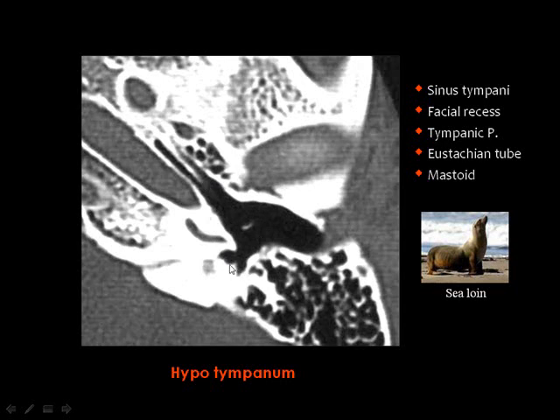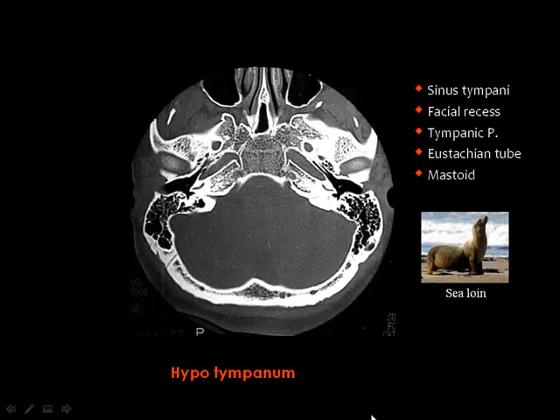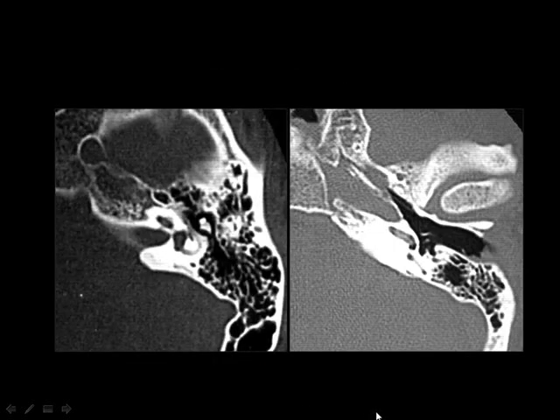And the elevation is known as the tympanic pyramid, and of the depressions, the medial one is known as the sinus tympani, and the outer one is known as the facial recess. Then looking once more at the anatomy of the middle ear, which starts by identification of the ice cream cone.